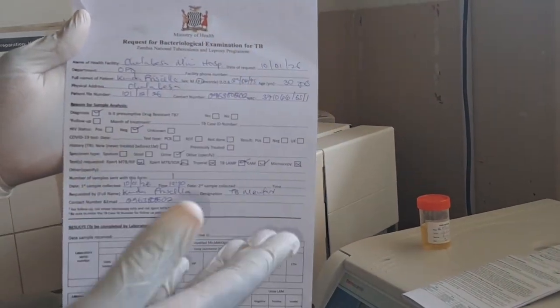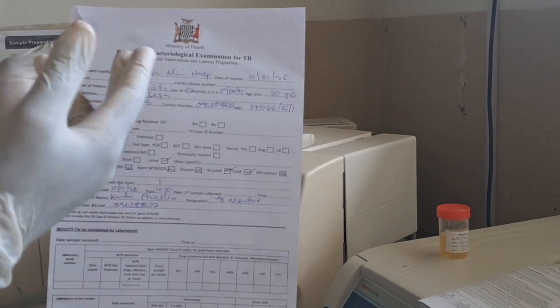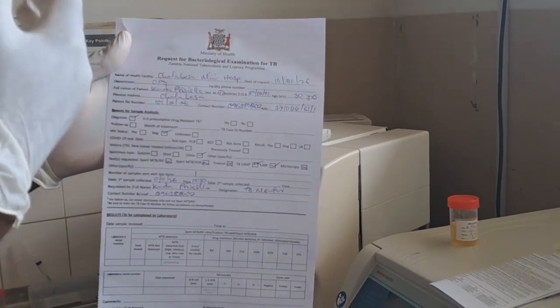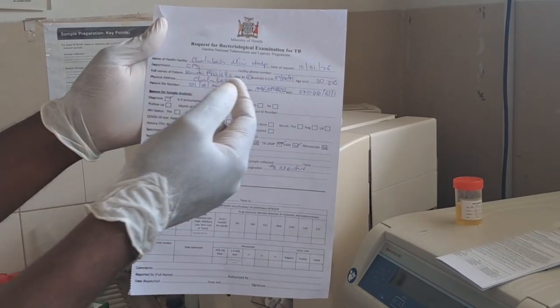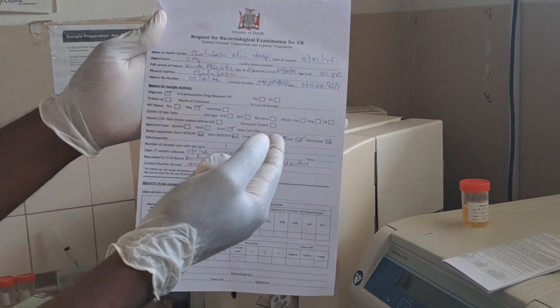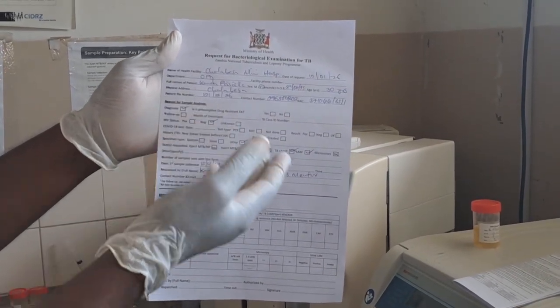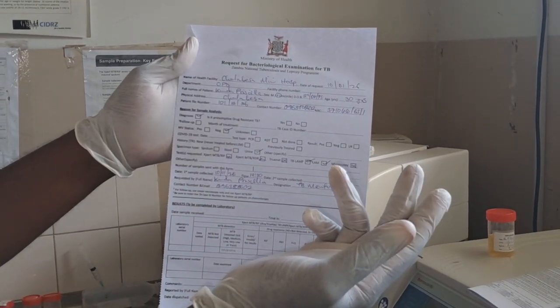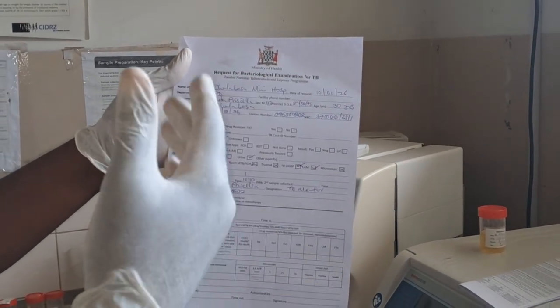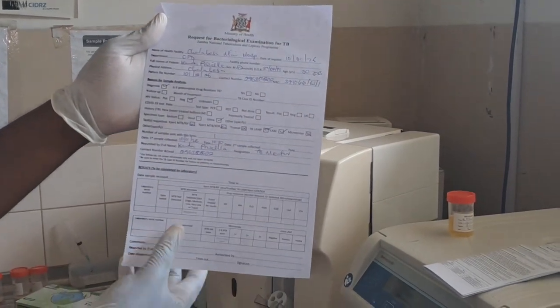Like you have seen this one. Name of health facility, where you are from, the department where the sample has been collected, whether it is ART, the community, or OPD. Then you put the patient's full names, the sex of the patient, date of birth, even the years, and the patient's file number. If you have the phone number, sometimes some patients stay very far and once you do the procedure, they require a call. NRC number, if you have.